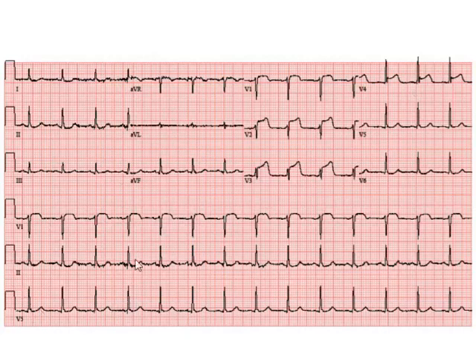Looking at the rhythm strips at the bottom of the tracing, we see that there are P waves before each and every QRS complex. The P waves are positive in lead 1 and in AVF, thus originating from the sinus node. The rate is about 85 beats per minute. The P waves have a normal shape in the inferior leads and in lead V1, so there is no left or right atrial enlargement. The PR interval is normal.